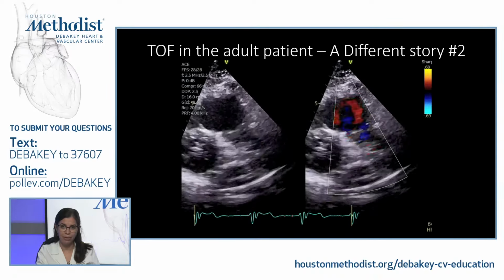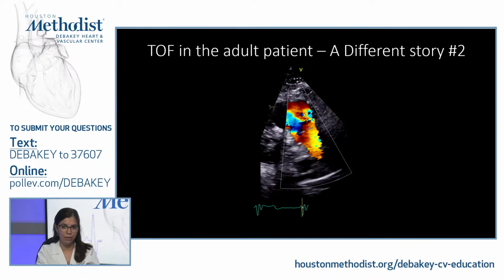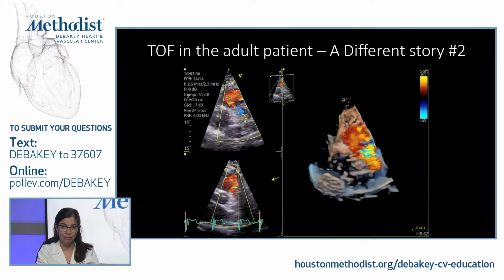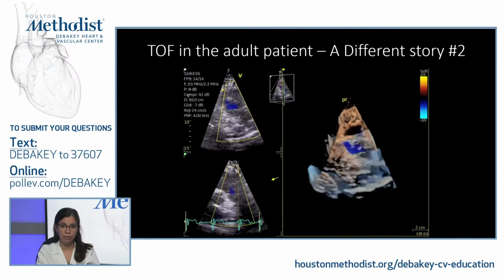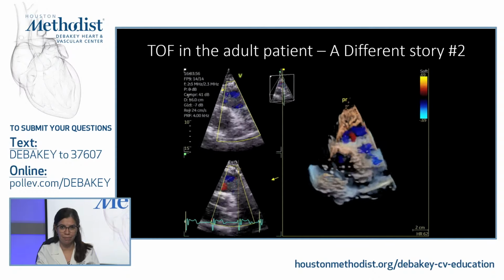Looking at these valves quickly can result in underestimation of the severity of the PR. So frame by frame always, to quantify accurately. And sometimes it's helpful to obtain 3D images of the valve for further assessment.